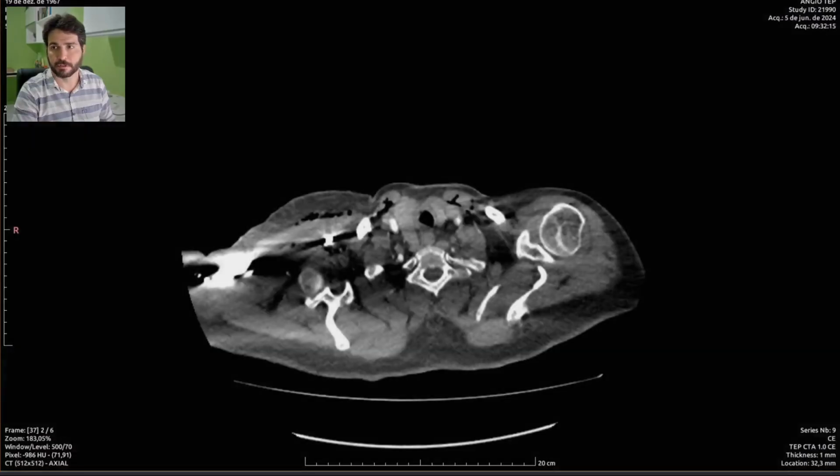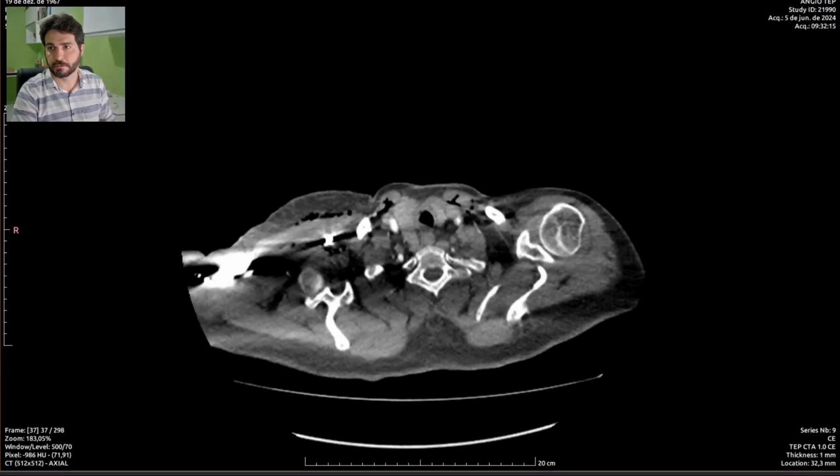I have already downloaded this exam. Let's just load it up on the workstation. I'm just going to anonymize everything so you guys can't tell who this patient is. Of course, that would be bad.